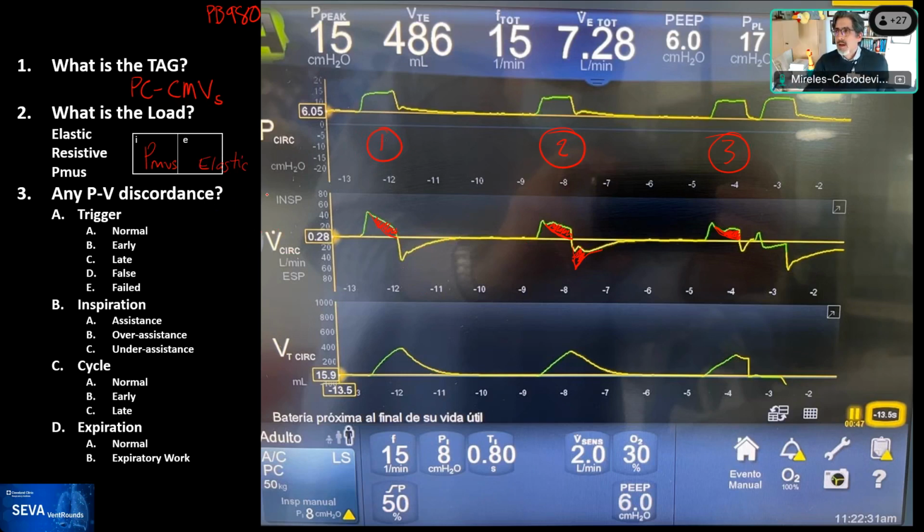So just let me go back, Jorge, because I have a couple of comments. One is coming from Rob, and I think it's important. And thank you, Angel Emilio, for talking about the exponential decay. Absolutely, that's the right way to describe this, an exponential decay to 0. So great point there. The second one is the area that we are drawing in between the flow waveform and what would be expected. And obviously, I'm drawing where I would expect it. That doesn't mean that it's the reality. It could be even worse than that.